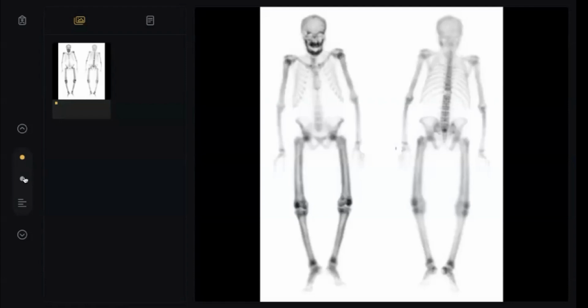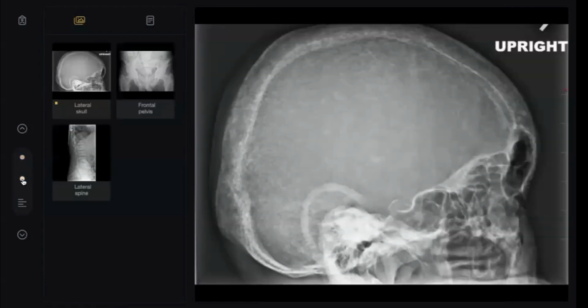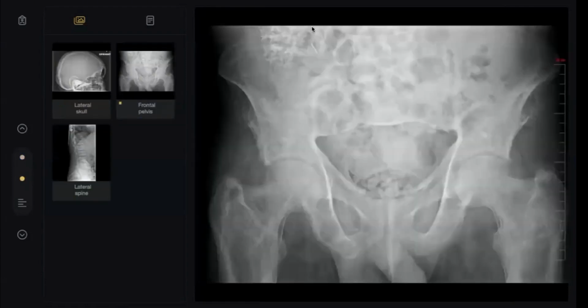I will revise the X-ray. What happened here, my colleague? Transplanted kidney. And what else? Osteopenic texture. Overall, this is osteopenic. Somebody will tell me, doctor, there is coarsening of the trabeculae. One of the most important signs of osteopenia is coarsening of the trabeculae. What is meant by coarsening? Most of us really didn't know the depth of this word.